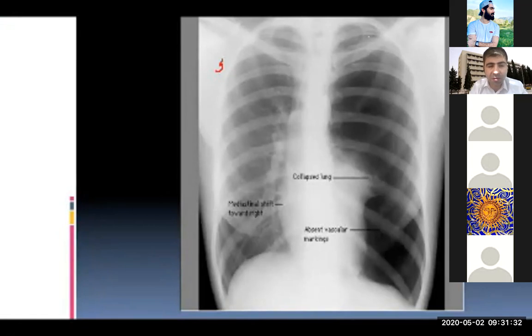So about the D, what's the problem with the diaphragm, for example? The left hemidiaphragm is almost flat. So it's flat and it is lower than the normal position, right? Yes. So we go for E, effusions. Is there any pericardial or pleural effusion, which are usually seen on this side? No. So for F, what do you see in the lung parenchyma? What's the difference between the right and the left side?